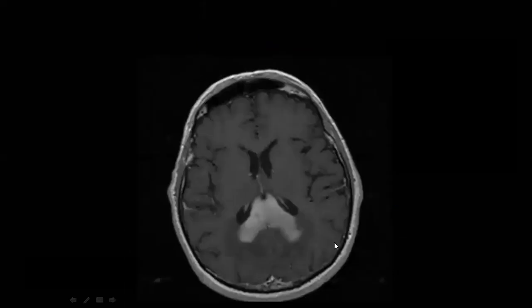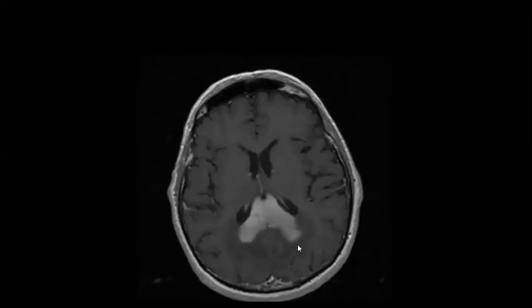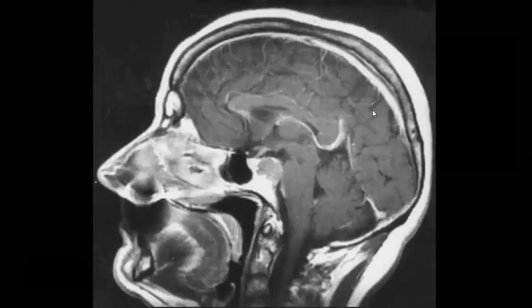So let's check. A midline lesion, which has a crossing appearance. Again, put lymphoma in your consideration. Lymphoma, metastasis, put them in all your considerations while you are moving everywhere, okay? Thank you, Dr. Muhammad. Yes.